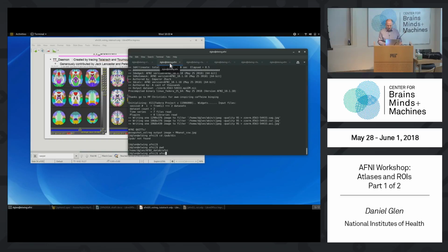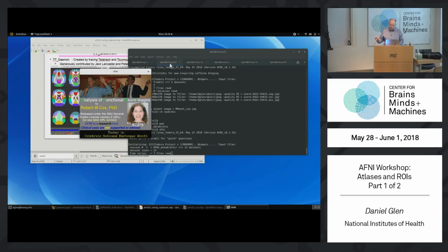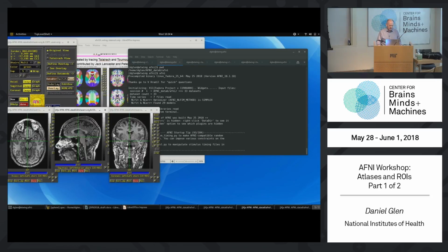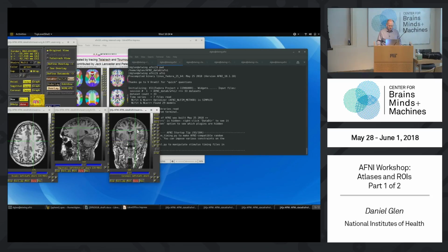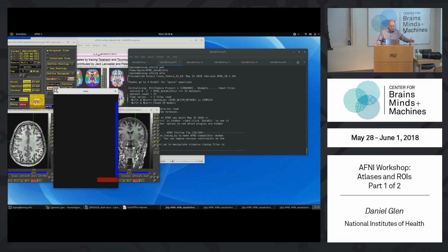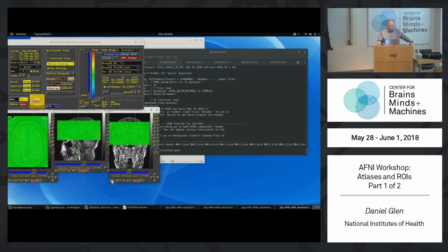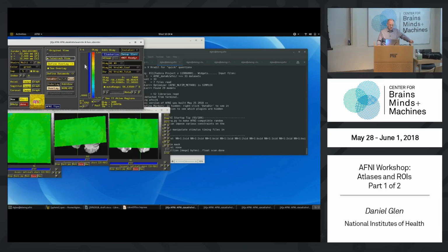Okay, so I'm going to start AFNI again in the AFNI Data 6 AFNI directory, just to show you how this works actually with a real subject. There could be functional activation on there. Let's do that just for fun here. And I will change to Func Slim in my overlay. Let's put that in Talairach view, standard space.